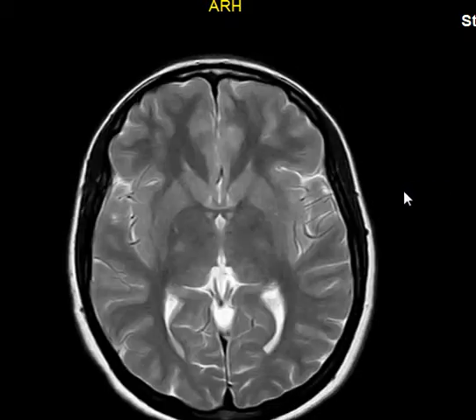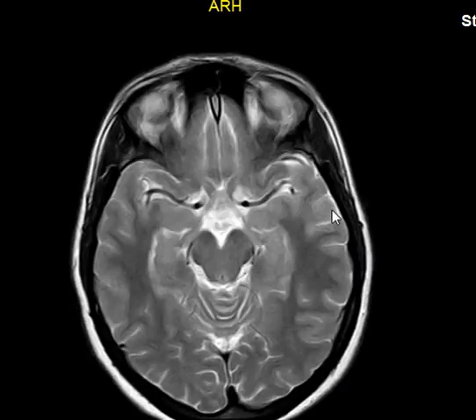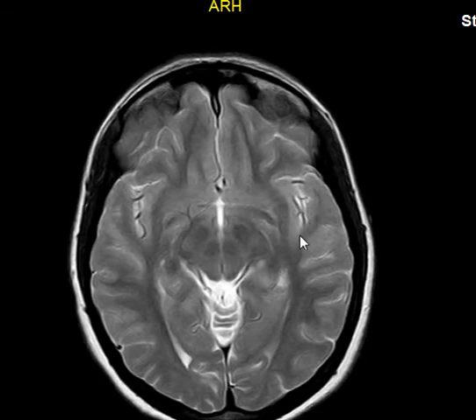Okay, and we agree that this is called the insula, and it's covered by what are called opercula, which are covers from the frontal, temporal, and parietal lobes. So there is a frontal operculum like this one, covering the insula. Operculum means cover. So this is a frontal operculum, a parietal operculum, and if you go down, you'll see the temporal operculum.